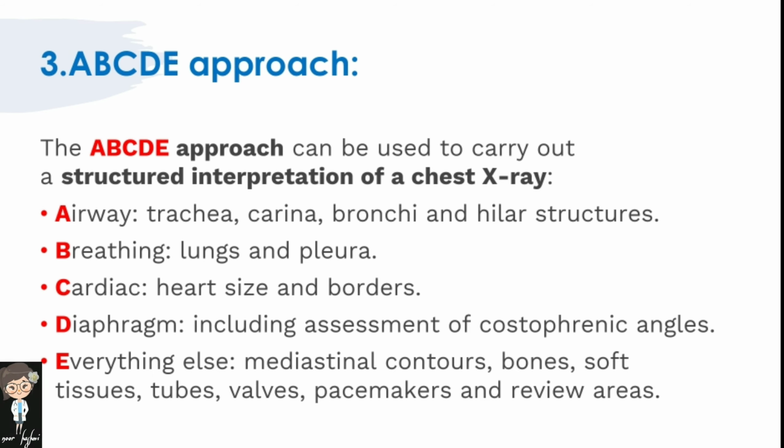Now we will see A, B, C, D and E one by one in detail. Airway contains trachea firstly, which is located centrally or deviating very slightly towards the right. If trachea appears deviated, inspect anything that could be pushing or pulling the trachea. Make sure to inspect for any paratracheal masses or lymphadenopathy. True tracheal deviation is due to large pleural effusion or tension pneumothorax causing pushing of trachea, while pulling of trachea is due to consolidation with associated lobar collapse.